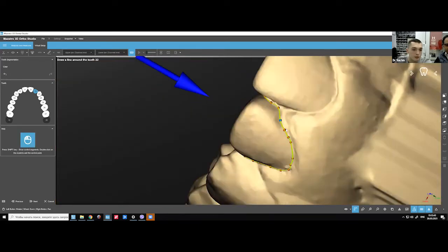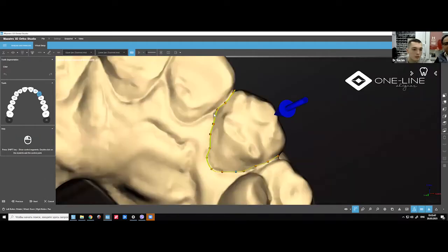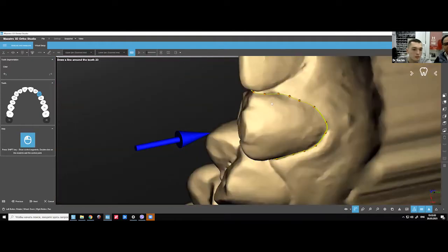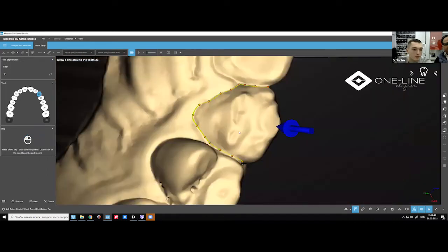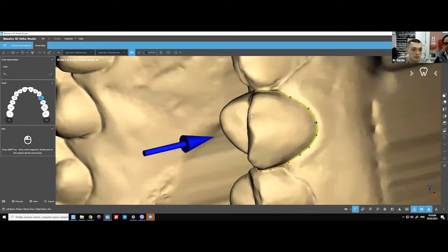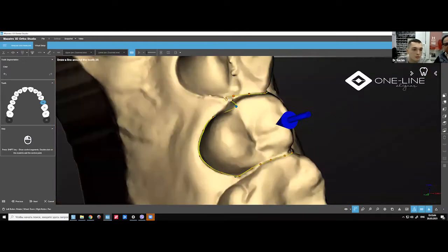So sometimes if you're not exactly on the line, it's not a big thing, especially on posterior teeth, if you're not doing posterior movements. In this case, this is a relapse case, so we'll be doing only movements on the first front four teeth.